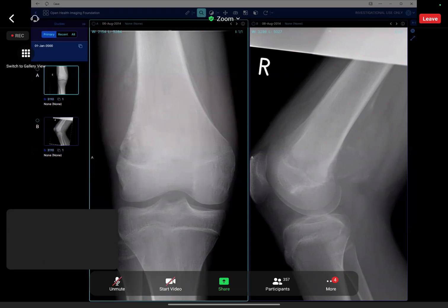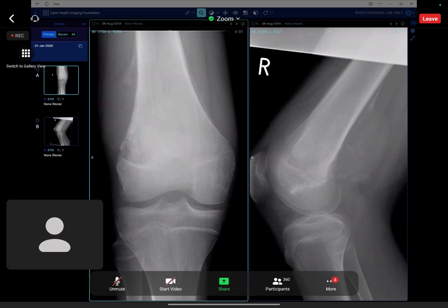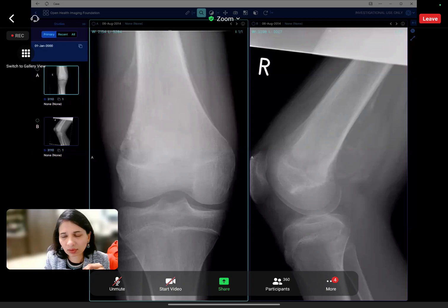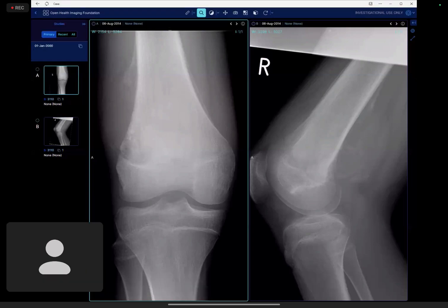On the lateral, I can't see an intraosseous lesion. But I would be concerned about osteosarcoma at this point. I would keep that as my first differential and would want further imaging with MRI to assess this region better. Also, urgent orthopedic review.